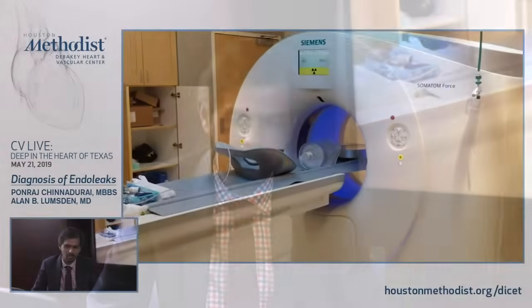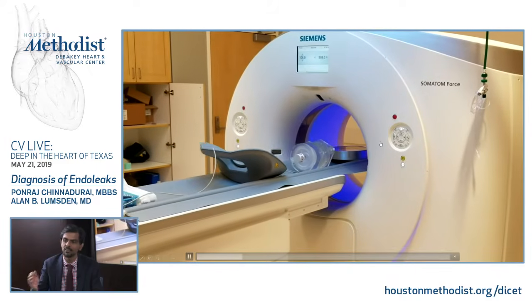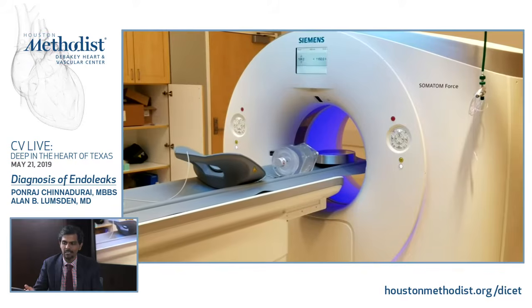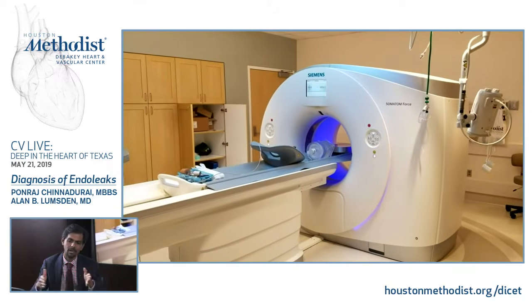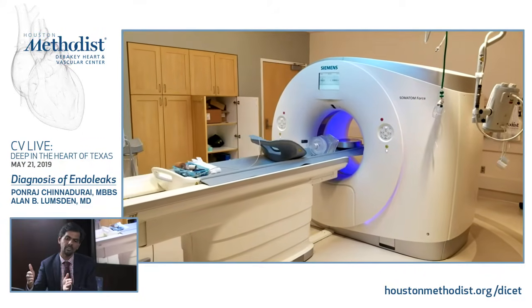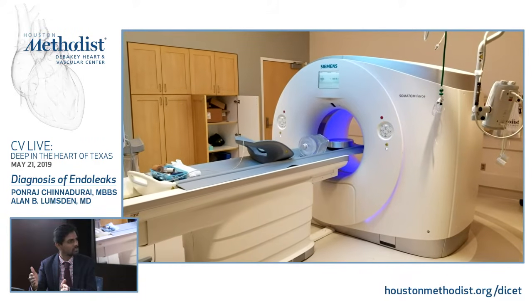So this video will hopefully illustrate the concept that I'm trying to convey. Here is a clock with a second hand, and we are trying to image the second hand movement every 3 seconds. And this is exactly what is happening when a patient is being scanned. The patient is lying on the table, and we are shuttling the table in and out to capture the region of interest and acquire images, shooting x-rays while this movement is happening.